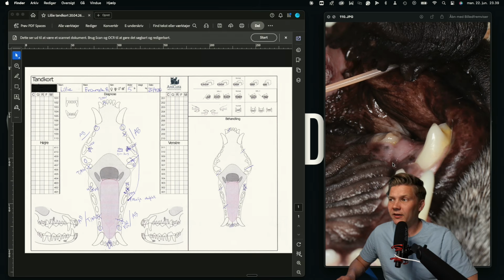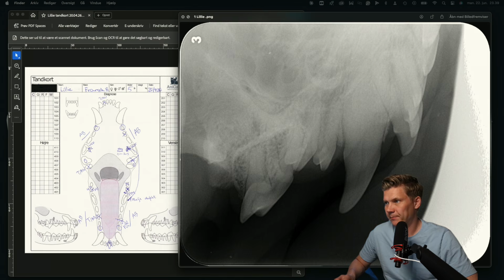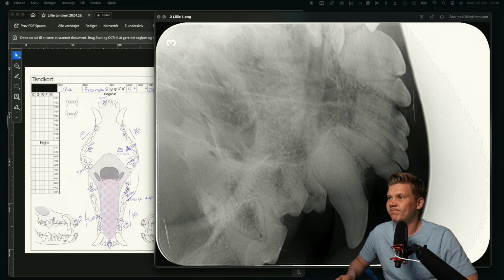If we do nothing, there eventually will be a periapical pathology, which can be a granuloma, a cyst, or an abscess. So just monitoring these is not an option. We have to extract this tooth right here. All right, so let's move on to the next x-ray.